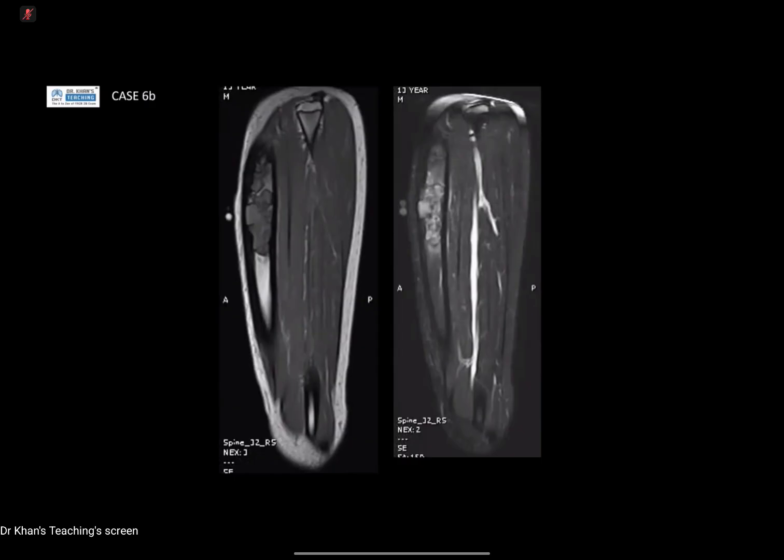With subtle edema on the medial, but I can see the lateral cortex to the fibula. I can see it well defined, but the medial cortex is encroached and destroyed. And so actually, do you mind if I stop you? Is that okay? Actually, the cortex is thickened. You have what looks like endosteal scalloping. Sorry. Yeah, no, on T1 I can see the cortex well defined. It is basically growing into the cortex.